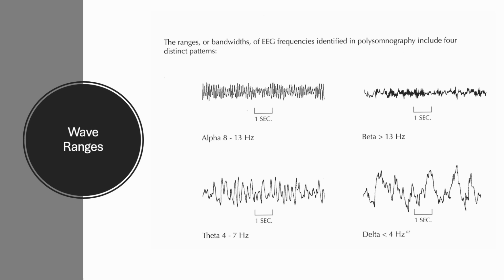This is exactly how old-style pen and paper sleep study machines worked. As the paper moved, the pins would deflect up or down, fast or slow, and you could tell what kind of waves they are by their amplitude, or how big they are, their duration, how much time they take up, and their morphology, what they look like. Personally, I remember it as DTAB, so that they are in order from least frequency to greatest frequency: delta, theta, alpha, beta. Delta waves are big and wide.